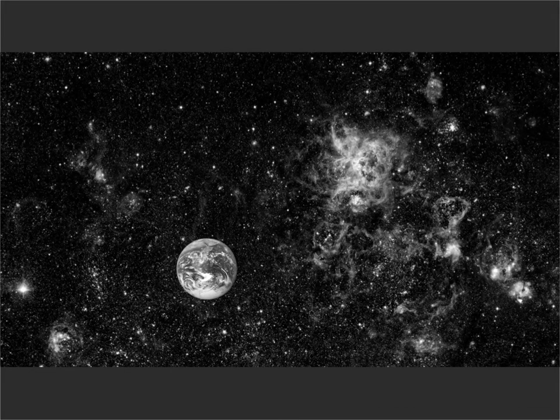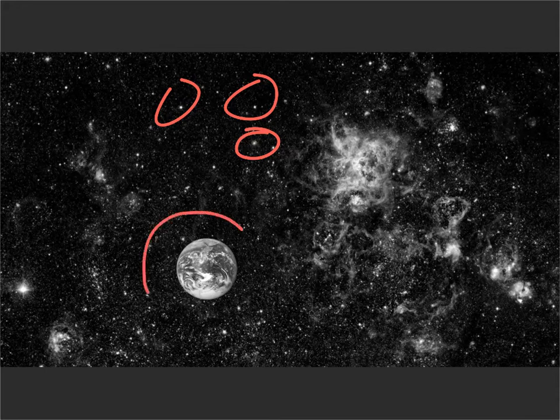I kind of like this image to help differentiate between these 3 different categories. So, here's your picture of the galaxy, and these individual stars out here, well, they're kind of like foci. You can't describe them as anything other than little bright spots on the background. A mass has 3-dimensional characteristics, so it's more like a planet. And this kind of fluffy, smudgy stuff that really doesn't have 3-dimensional characteristics is the equivalent here of a nebula, and it's a non-mass enhancement.